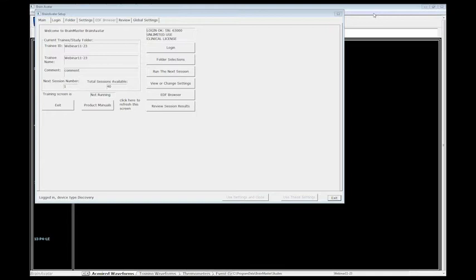So today I'm going to cover a couple of things, and I'm hoping I'm going to have enough time to cover it. One, I want to go through some of the different displays that we have out there and some of the different controls that go along with them. What I mean by that is, on the Acquisition tab, for example, you can have certain things displayed, certain bits of information displayed, certain bands displayed if you choose that. And I want to cover things like that.